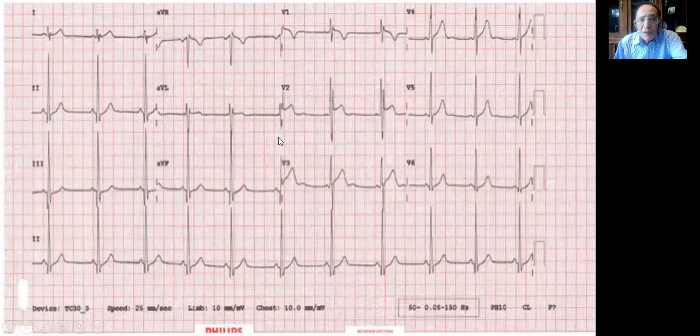Don't forget that there are causes of sudden death in athletes due to congenital anomalous coronary artery. Now we see this example, the raised ST with bifid QRS in V1, incomplete right bundle. This is early repolarization. This is acceptable in athletes. Abnormal but not pathological.